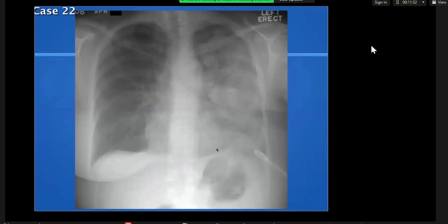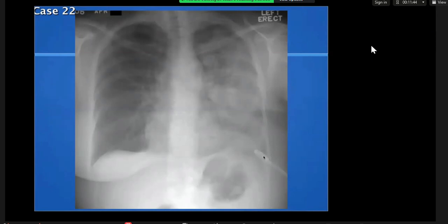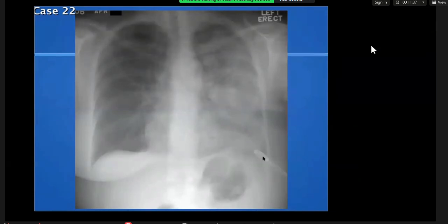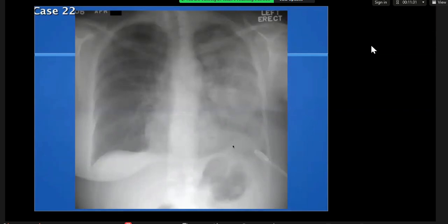Mm. Yeah. So it's more likely pulmonary edema. Okay. Unilateral pulmonary edema, and putting patients lying on the left side, that's one differential. And the other differential, since you spotted this, is the tube. Could the tube be in the wrong position? No.